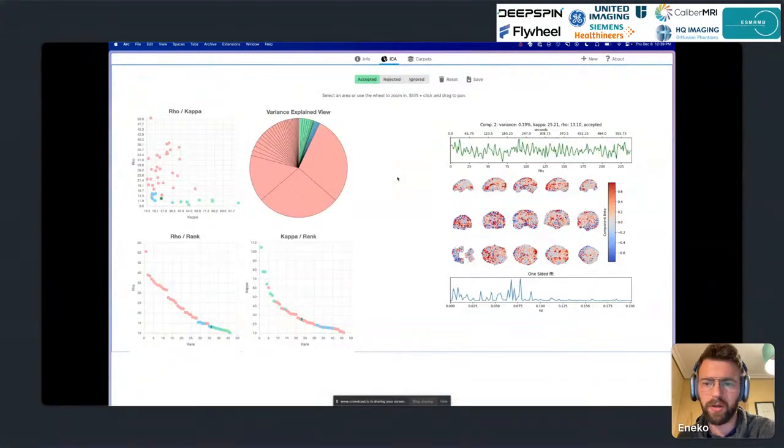We are also working on making... Well, I'm going to say that later. So this one, for instance, it looks kind of funny, right? It could be the CSF, maybe the time series is kind of high frequency-ish. That's probably related to some kind of pulsations. I'm going to reject it. You can use A to accept, R to reject on your keyboard.